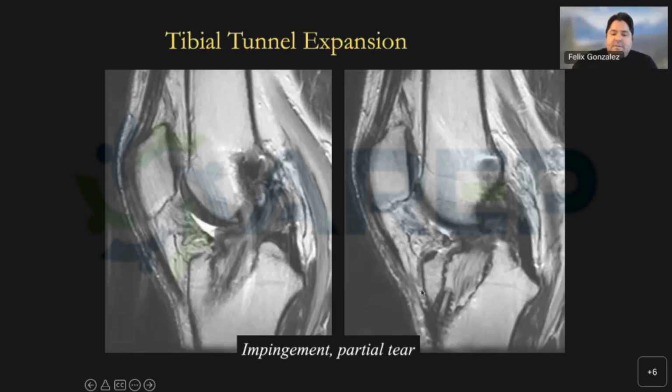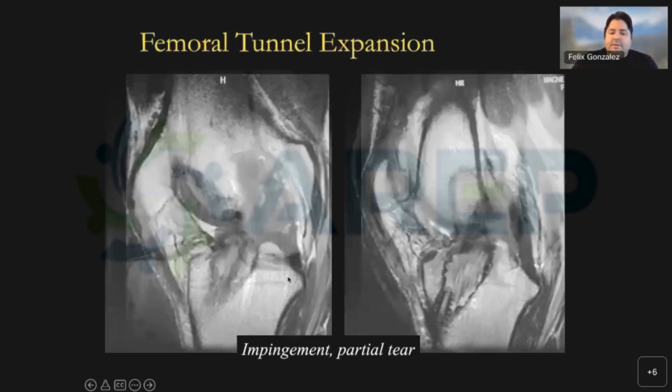Here's a tunnel expansion. Look at the tibial tunnel, right? Huge, and a lot of fluid. Ganglion cysts, those fibers are not even attached anymore. A lot of them are actually avulsed, and they are recessing within the anterior compartment here, the anterior synovial recess. This shows distracted fibers with now arthrofibrosis, right? Cyclops lesion. But this is a highly unstable graft. You can have impingement. You can see the undulated appearance of the graft fibers here with impingement.